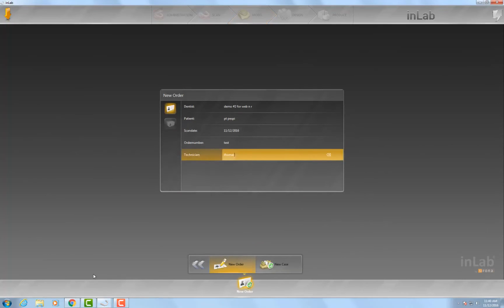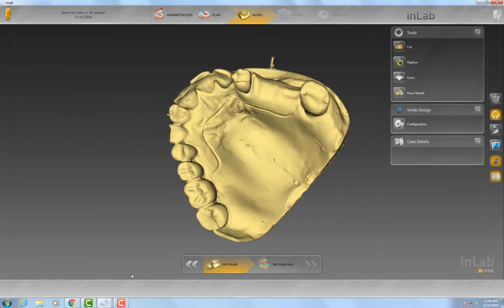What I'll usually end up doing now is I'm going to use the same design, but I'm going to show you how we actually do this in flexibles, which is basically just what we did, just with a lot less complexity.